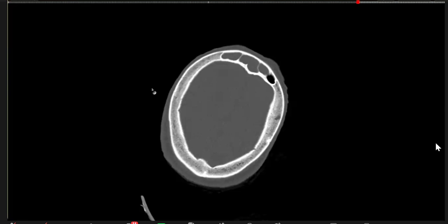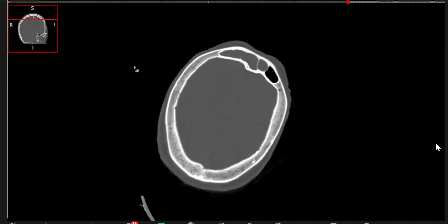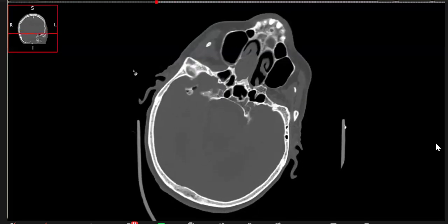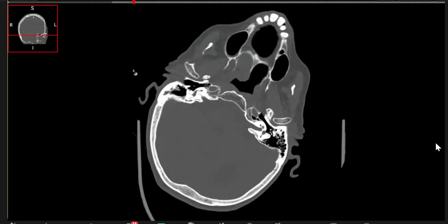Sir, it is not scrolling now. So let me scroll it for you. So I'll go down. Now I'm coming up.